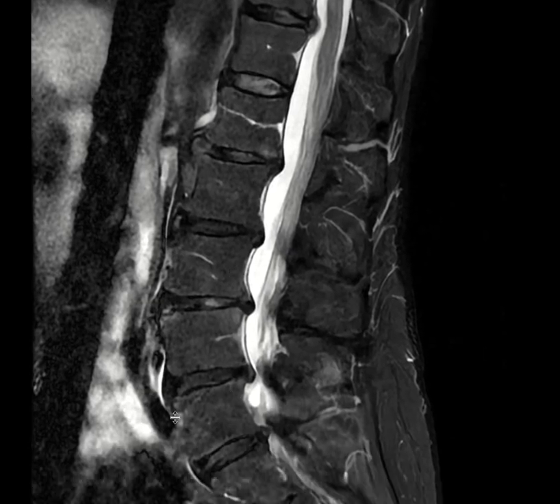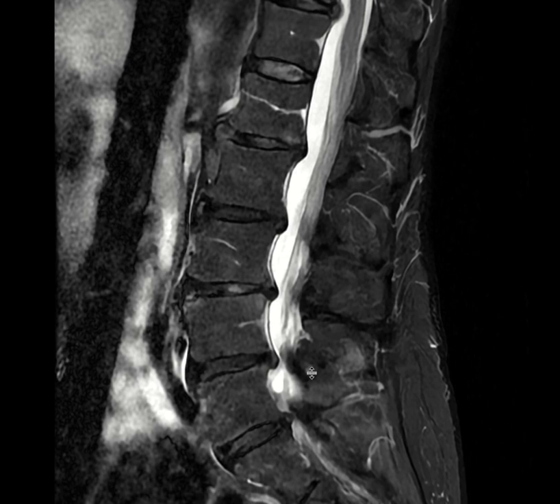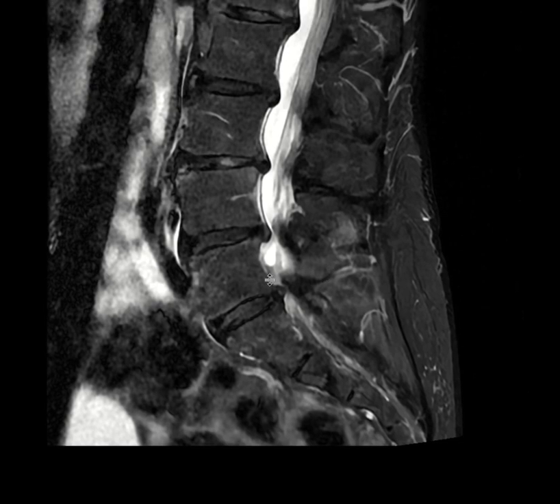But just make sure everything on this screen is our responsibility as a radiologist. We also need to look at the soft tissues, the spinal column, and also the sacrum. That's the area of interest on this study that I want you guys to pay attention to. This is the area that we may overlook if we don't pay attention.